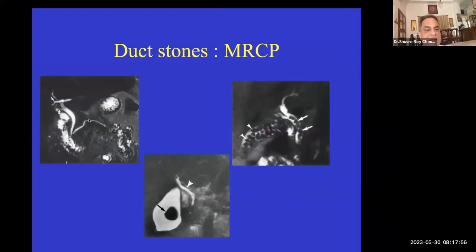So this is a standard MRCP. If you look at the intrahepatic bile duct, this is the duodenum. This is a bit of the gallbladder, cystic duct coming like this. Can you see my arrow, Makunda? Yes, yes, you can see.